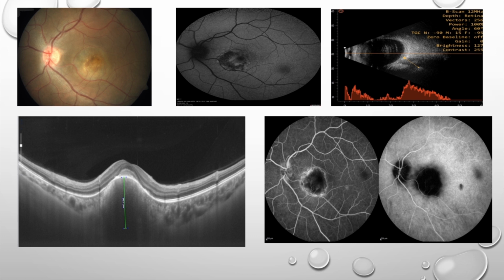And even after that, they started changing it. Why? As they found out new things, they started changing with that. And every single modality being used in the diagnosis, for instance lipofuscin, you can see the orange pigment, but many a time more clearly on the AF, autofluorescence.